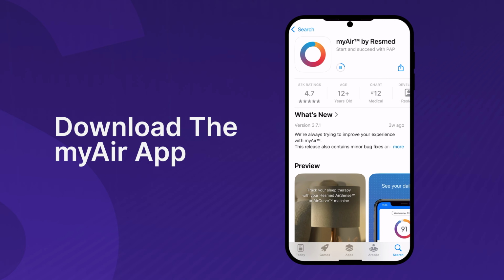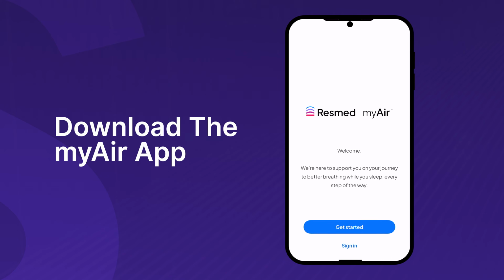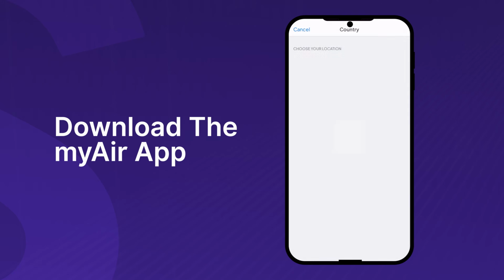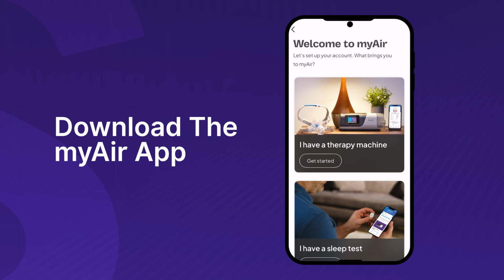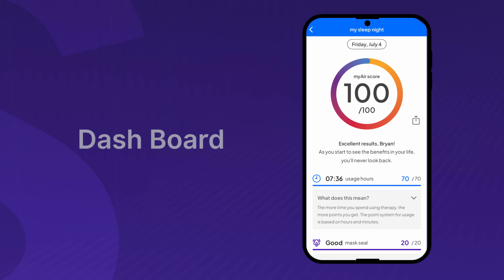To start, download the myAir by ResMed on your phone if you haven't already done so. It's available for Android and Apple. Once you're there, create an account. Registration takes 60 seconds. Email, password, select your machine, AirSense or AirCurve, enter the device serial and device number, and you're in. The app immediately syncs with your CPAP via Bluetooth or built-in cellular, and you land on your dashboard, the control center for your sleep.